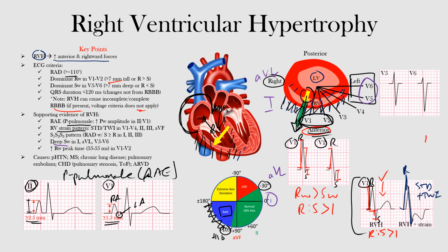And these deep S waves will be in these leads. Notice here's our S waves, and they're all deep in these cases. Now, that's another supporting finding.